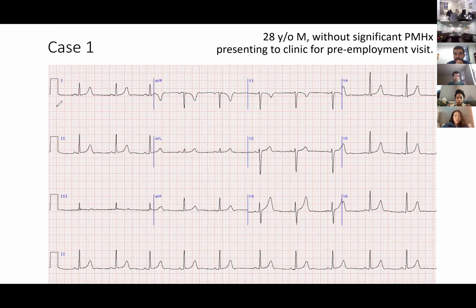Okay, so as you saw, Juan already knows who the patient is. So he's talking about standardization based on this, right? Yes. So a rectangle that is 2 big boxes means 10 millimeters per millivolt. Okay, so at least you know that the amplitude, whatever conclusion he goes through, should be okay. Okay, go ahead.